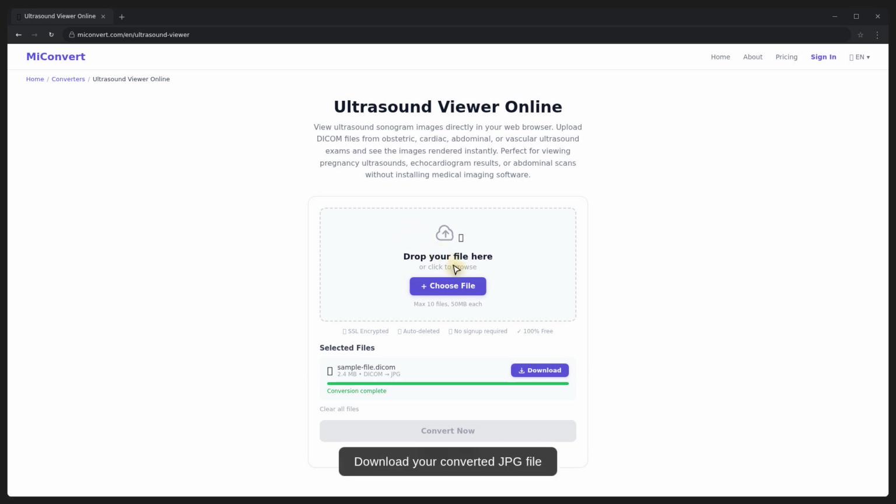Done. Your file has been successfully converted. Click Download to save the JPG file to your computer.